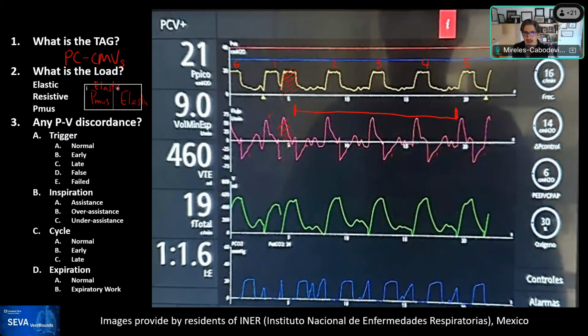Very regular behavior here. And it crosses the baseline with a significant amount of flow. I mean, this is above, and if I move over here, it's probably close to, I don't know, 10 of pressure. And remember that the flow gets amplified, and you can see it better over here.